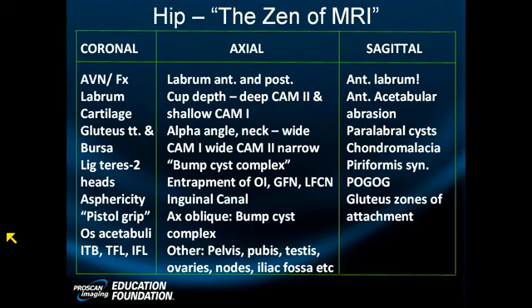But we do see a little bit of swelling in the medullary bone. Let's take a look at the axial oblique. Not very conspicuous on the T1 weighted image. See what else we have.